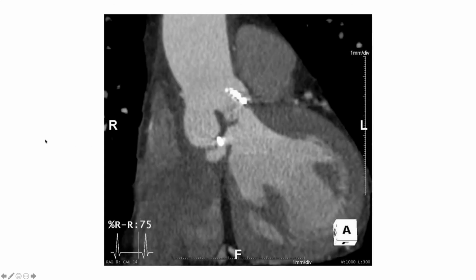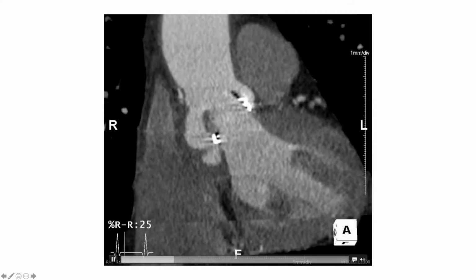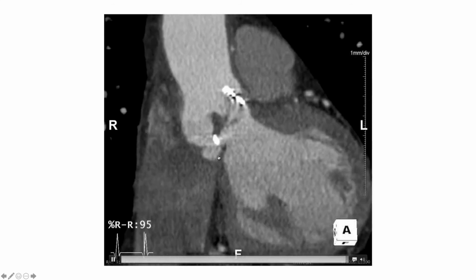So she had a nodal excision, which was negative for sarcoid or malignancy, and then she eventually had a biopsy of the septum on the right ventricular side, and so this is sarcoid. So really quite mass-like and likely active.